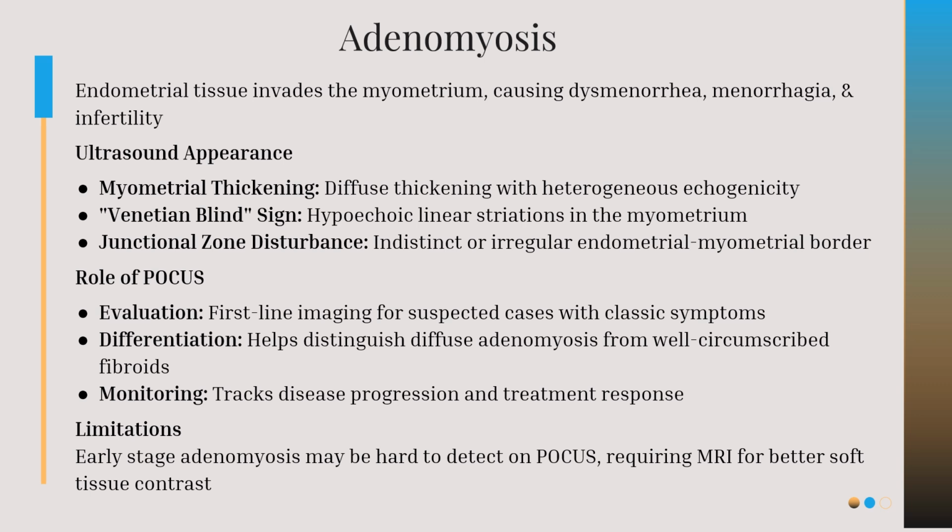That's more of an advanced skill that not all clinicians can see, but if you're noticing that there's symptoms present and you're having some of these other issues, you could definitely just say you're suspecting XYZ and then send them in for a further formal ultrasound. Junctional zone disturbances, indistinct, irregular endometrial, myometrial borders with your ultrasound is another sign to watch for.